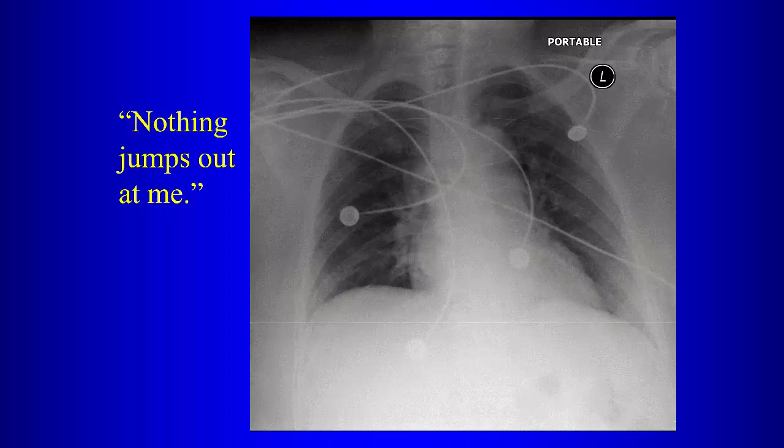They're not able to say, my shoulder hurts. And especially patients who've been in the ICU, they get moved around a lot. So they can develop shoulder dislocations that are actually missed on the chest radiograph because we didn't look hard enough. So make sure that the edges of the film, bones, soft tissues, all of that, are on your checklist, okay?